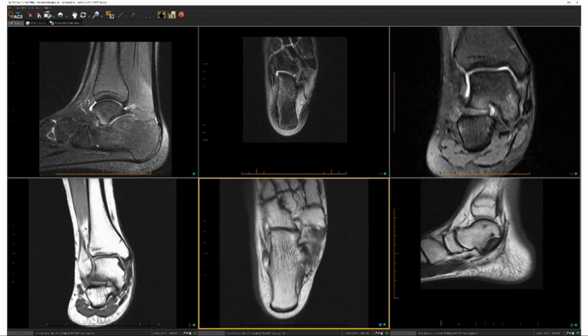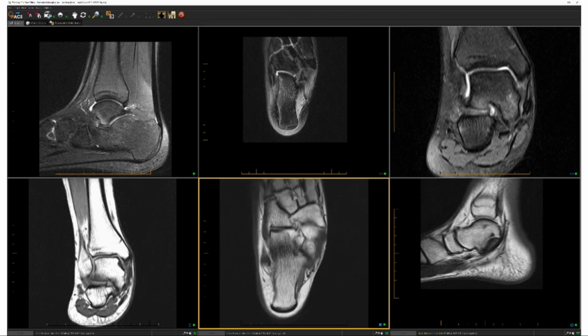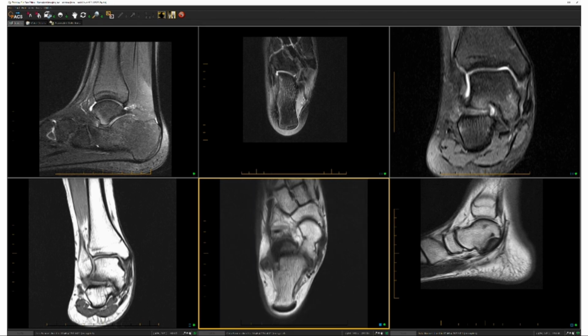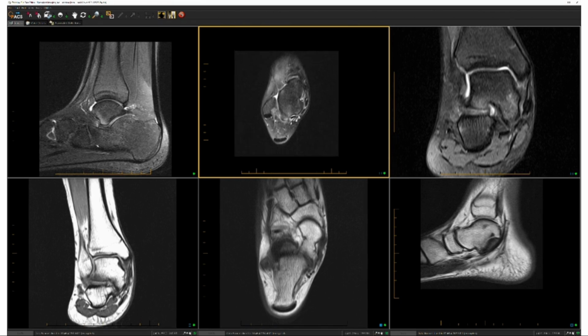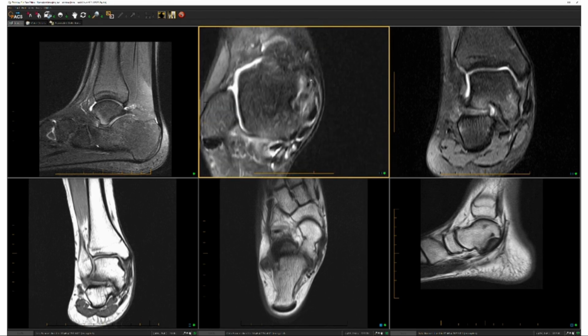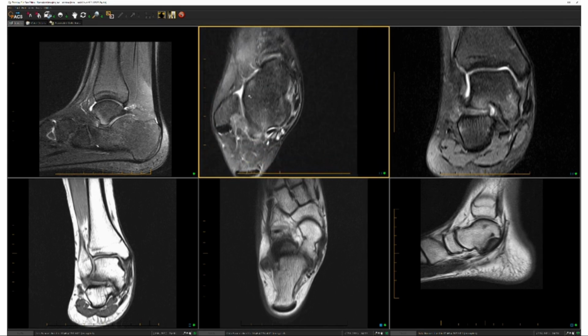Think about this area not undergoing the normal biomechanical stresses when we heel strike. There not being the ability to glide at all through this region of the joint. And of course, we'll have to have a heavier pronation strike underneath the talus. And when you think about those things all together, that can help you understand the origin of the ligamentous injuries and help you decide whether or not you're comfortable calling this a spring ligament sprain with synovitis when you see changes that occur here, and help you make a more accurate read.